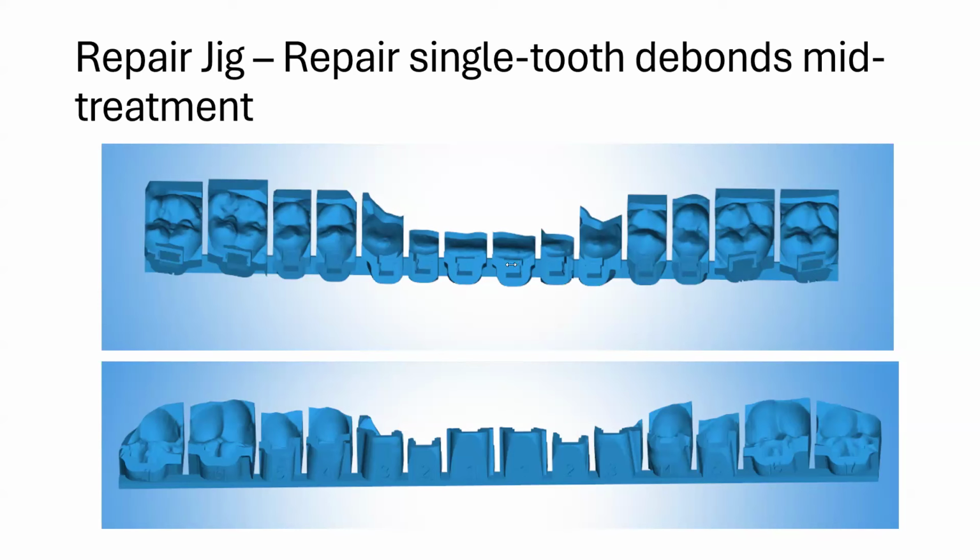So I do see this, and where this most frequently comes into play is those lower sixes. As you do wedge it, it does push that tooth more lingual. So you kind of just have to find the happy spot, and I don't significantly compensate the adjacent teeth to make up for it.